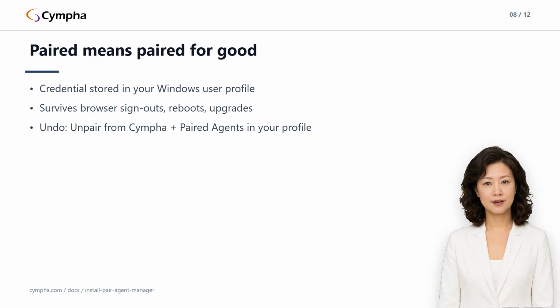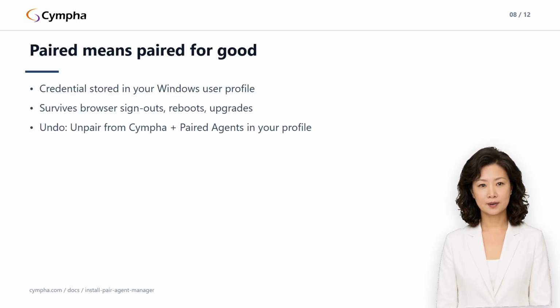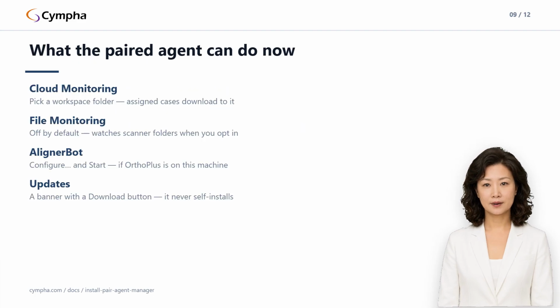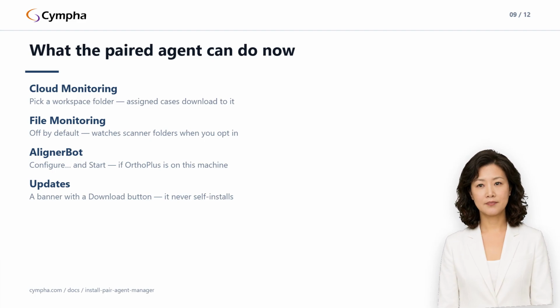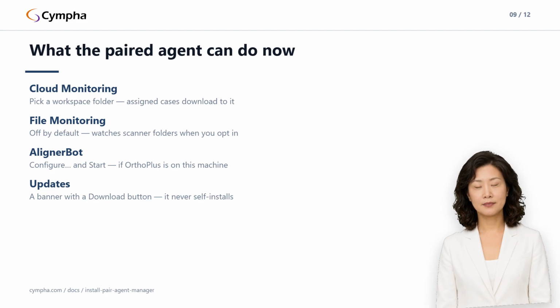If OrthoPlus is installed, the AlignerBot submenu gives you Configure and Start, with a read-only status line showing the live worker state. And updates. When a new version ships, the agent shows a banner with a download button that opens your browser. It never installs anything itself. You run the new installer when you choose, and the pairing carries over.